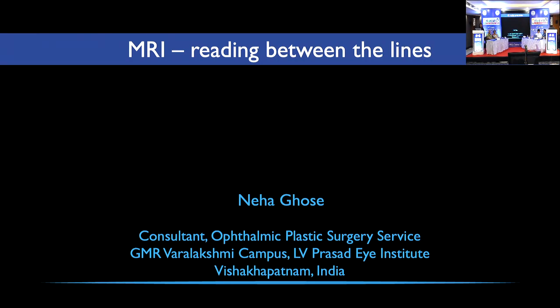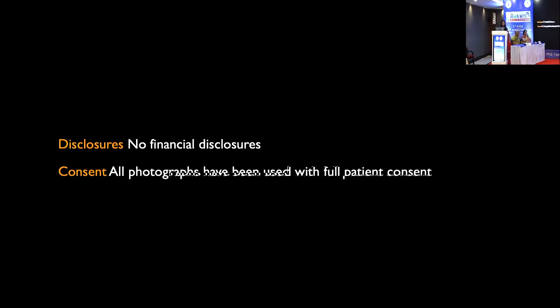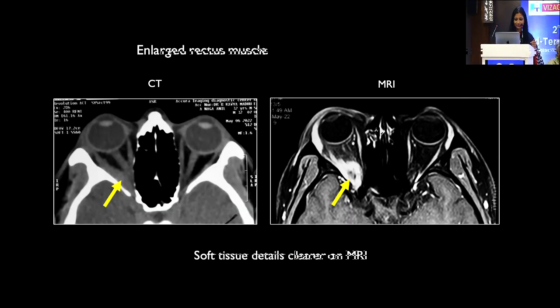The topic for my presentation today is MRI, reading between the lines for ophthalmologists. This will be an entirely case-based approach. I have no financial disclosures and all photographs have been used with full patient consent. So let us start off by talking about this particular case.